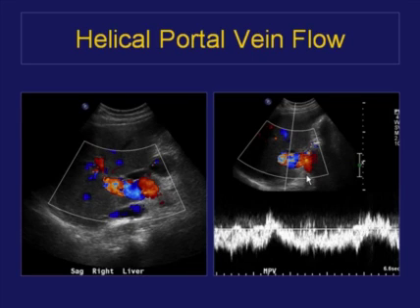Another unusual pattern that one can see in the portal vein is this one. It is a very pretty one. It's red, blue, in a sort of candy cane circling thing, and that is due to helical flow in the portal vein. It doesn't mean that the flow is going towards the liver and then reversing and towards the liver, but rather a spiral of flow, and as the spiral comes towards or away from the transducer, the corresponding color changes from red to blue to red, and so you get this kind of pattern.